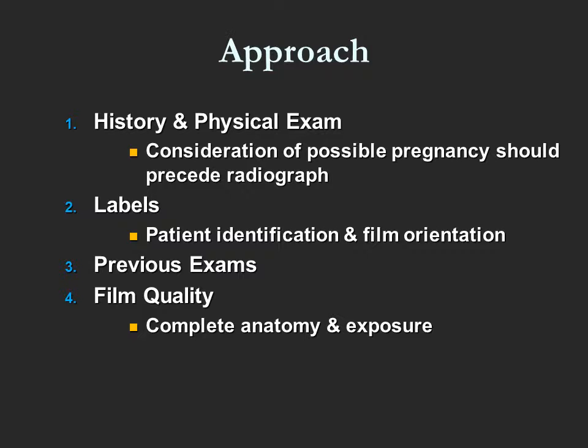Second, in reading the radiograph, use labels and markers to ensure that the radiograph is positioned properly and establish the projection and position of the film. Also, check that the film is for the correct patient. Third, always look to see whether old films are available for comparison. Lastly, ensure that the film quality is adequate in terms of completeness and exposure.